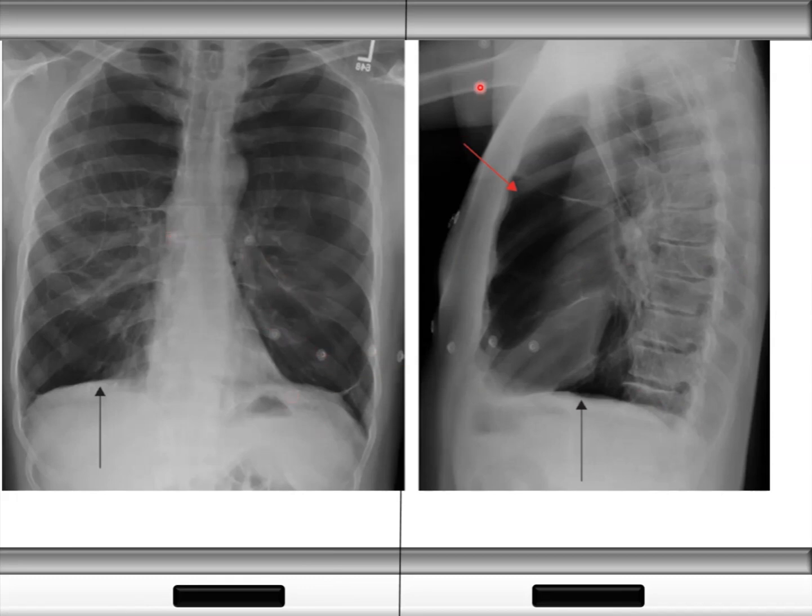The other thing I want you to look at is this. If you look really closely, do you see this little dot right here? See how it's really circular? And there's one here too, and here too, and here too. Now these can occur on anybody's chest x-ray. Are they tiny lesions? Is that the beginning of lung cancer because this is a smoker? The answer is no. That is literally the cross-section of a pulmonary blood vessel that's looking straight at you. The pulmonary vessel is running straight toward the camera, and the camera is capturing the cross-section of that blood vessel. So when you see those, remember that can be a normal finding on a chest film as well.